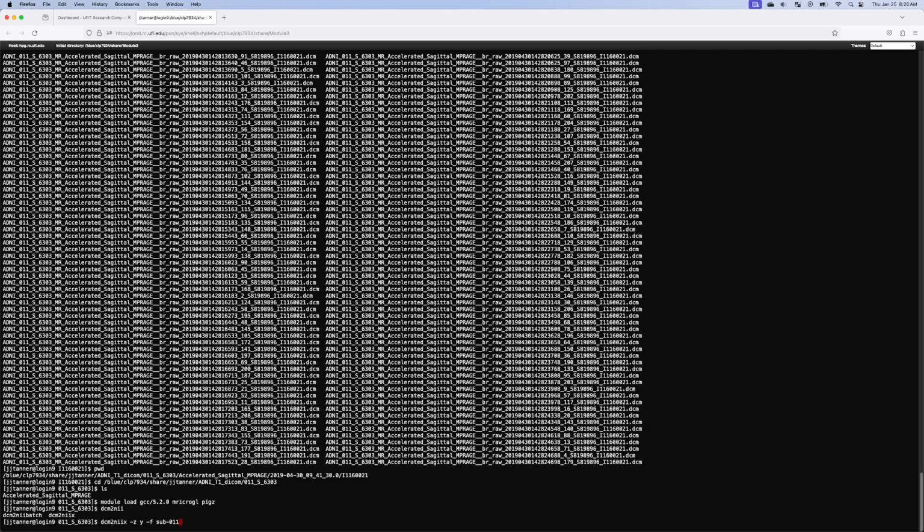I'm just going to squish everything together. Could probably do the underscores but underscores also mean something else in here. Actually, I should say you probably can't do the underscores. And so I'm just going to squish it all together.